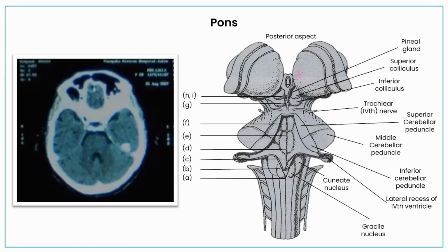Let's come back to the slide here and look at this picture. Just follow the arrow mark which I am showing. Can you see this image which looks like a tooth and enamel, where you can see there are two structures at the bottom? There is a brainstem here and there are two structures which resemble a horseshoe. So this particular image is nothing but your middle cerebellar peduncles.